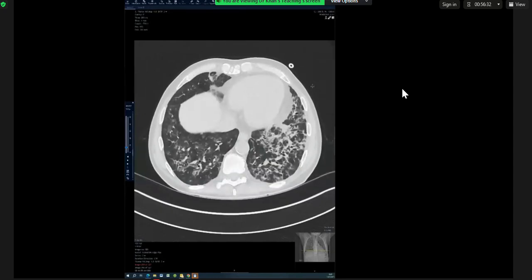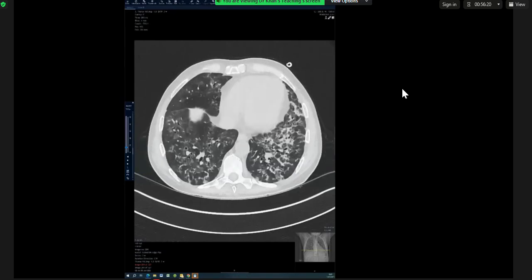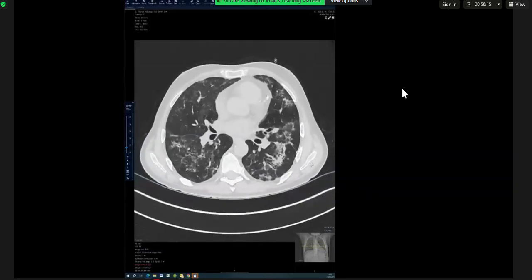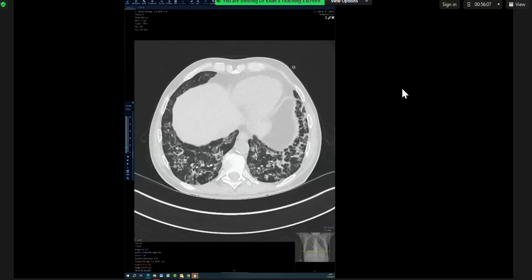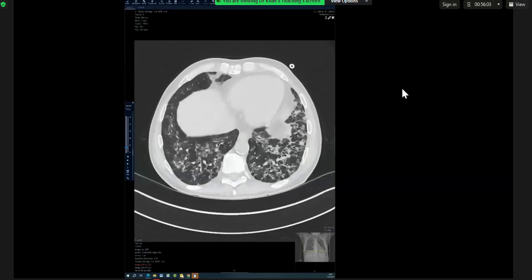Yeah. So does that automatically mean halo sign? Halo would usually be used for more nodal looking areas. Yeah, and the solid bit needs to be a bit more rounded with surrounding ground glass to call it a halo. This is all, like you said, consolidation. I agree, there's ground glass. After that, you need to think about what that consolidation and ground glass is doing. So this ground glass and consolidation is causing something. It's pulling on the lung.